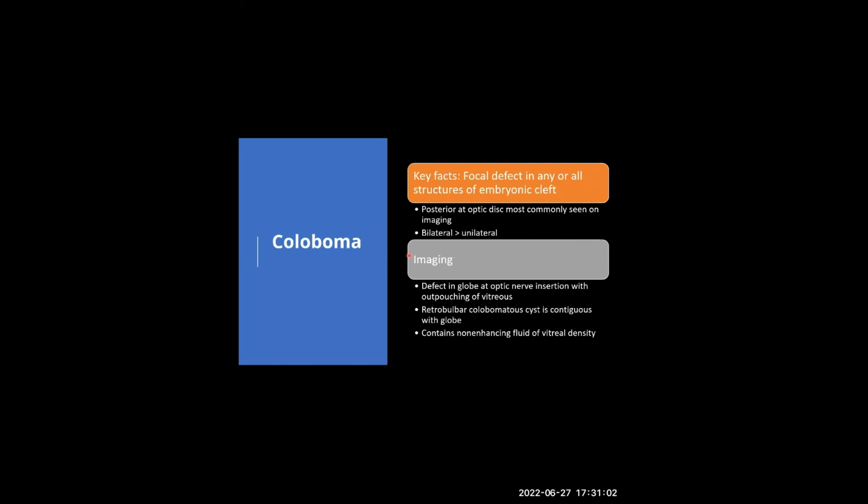Next pathology. I know that I'm a bit chaotic today, but I want you to keep these variable pathologies in your mind. So we are speaking about intraconal and some extraconal.